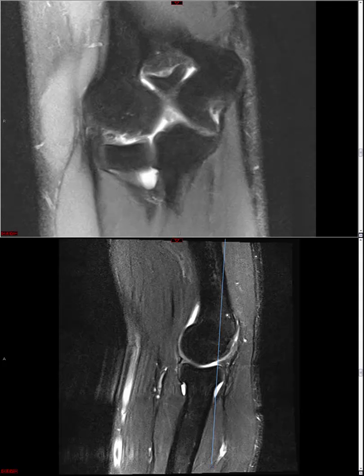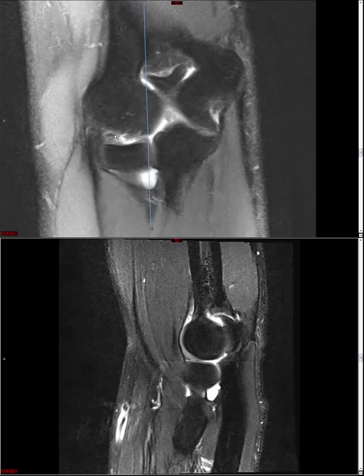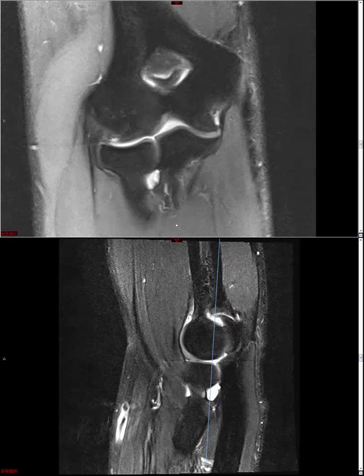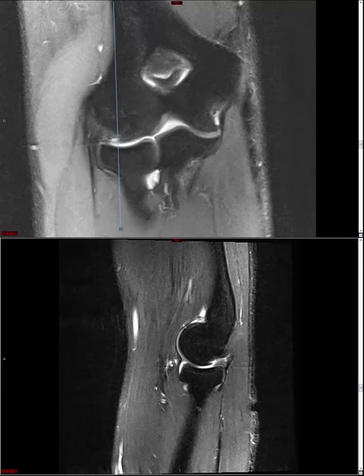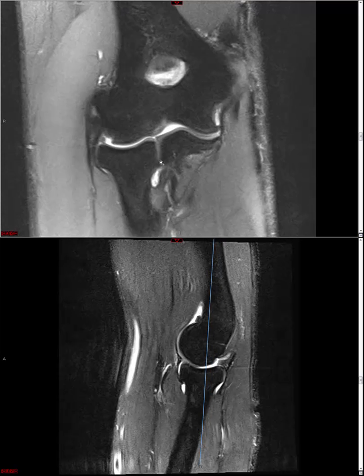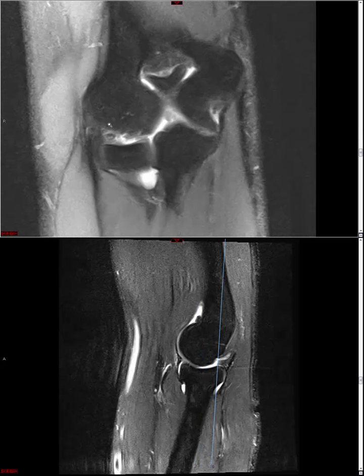But notice where my localizer is. It's actually quite posterior. So this in fact represents the junction between the capitellum and lateral epicondyle, and it has this normal irregular appearance. So don't mistake this for an osteochondral lesion. Typical osteochondral lesions will be more anterior, and Panner's disease, being an osteochondrosis of the capitellum, also classically happens anteriorly. So here's our capitellar articular surface, and then the pseudodefect of the capitellum, notice how much more posterior it is. So nice intact cartilage anteriorly, pseudodefect of the capitellum posteriorly, normal variant, don't call this pathology.